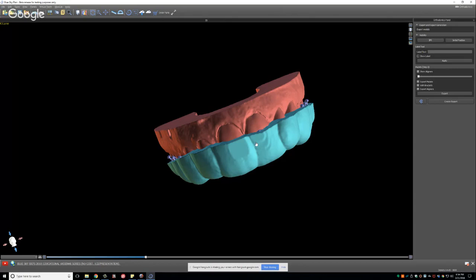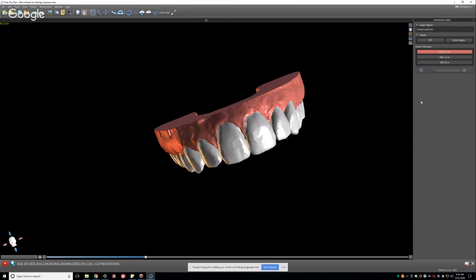So regarding the virtual tooth, for example, you're actually able to align a virtual tooth with the roots to the teeth, so that when you then move the tooth, you're pivoting the tooth together with the virtual tooth with the root, which will help visualize how that's going to affect the planning.